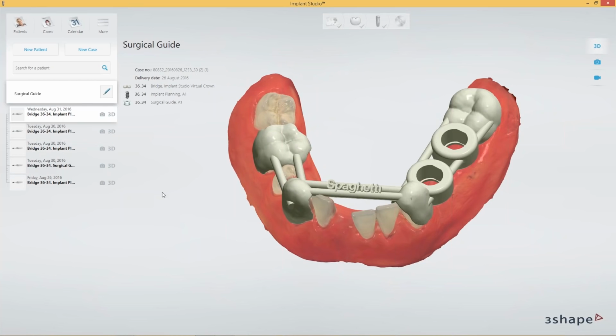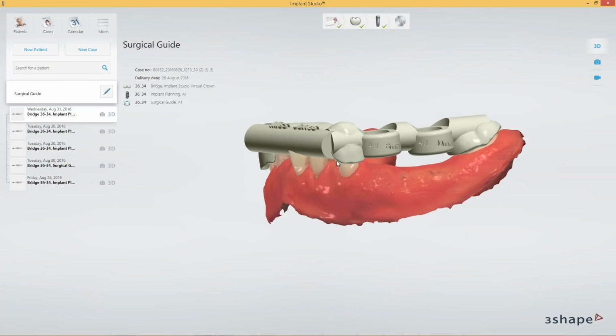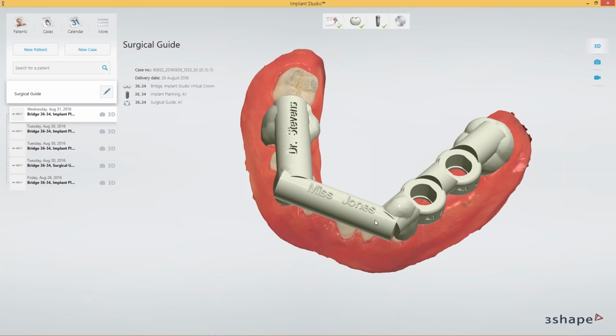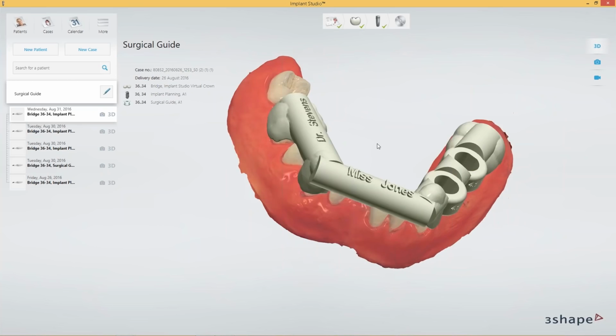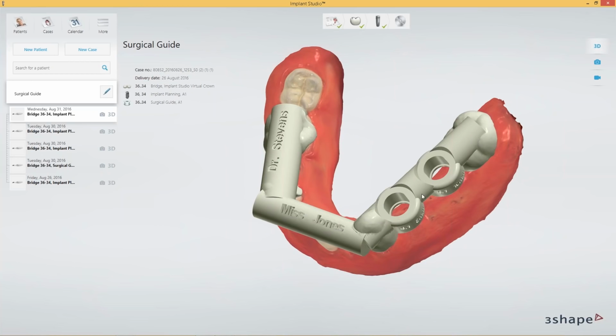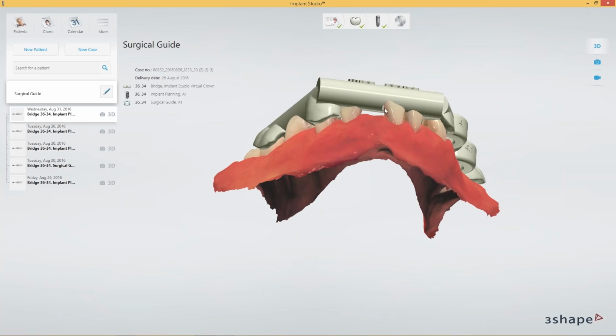And now for a completely new design that I don't think you have seen at all. It's the bulkhead design, where we actually use the circular bars just on top, placing them like three bulkheads on top, and of course the software cuts everything out and adapts it underneath. We can even see underneath here that there was a small undercut when placing the bar, but of course it calculates this and removes it so I can get it on and off the tooth in hand.